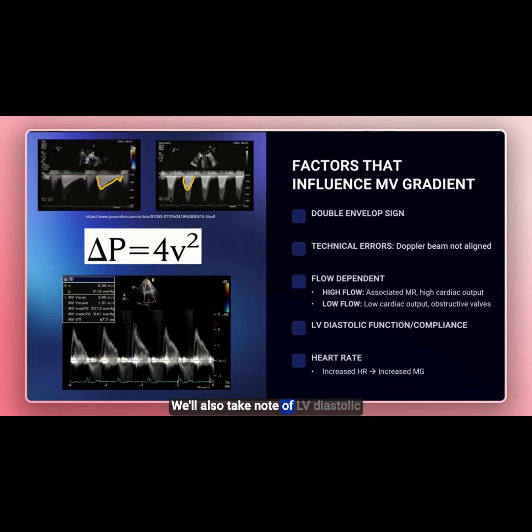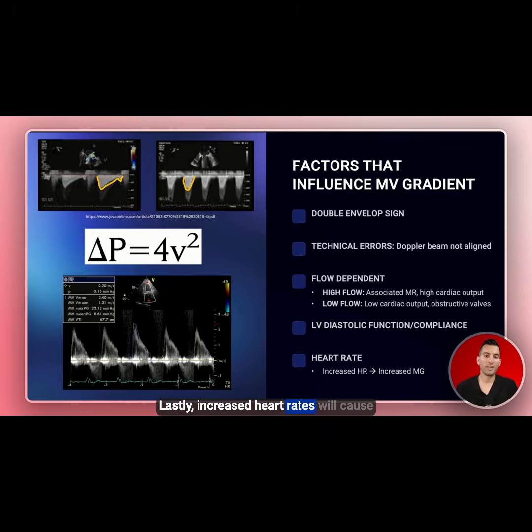We'll also take note of LV diastolic function and compliance. Lastly, increased heart rates will cause increased mean gradient measurement.